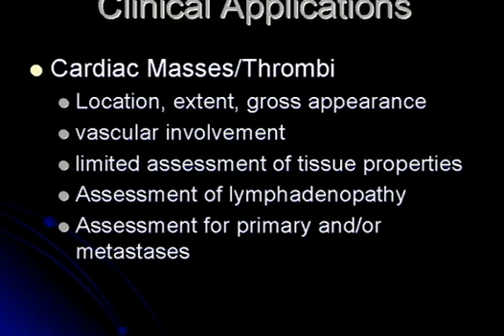Moving on to cardiac masses. Although we have limited assessment of tissue properties with CT imaging, unlike MR imaging, we can get information about the location and extent of any masses, vascular involvement, and assess for lymphadenopathy and for other primaries or metastases.